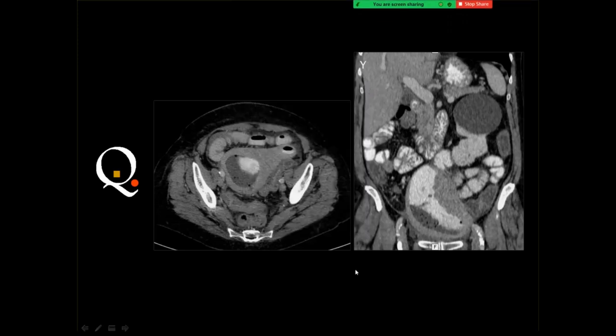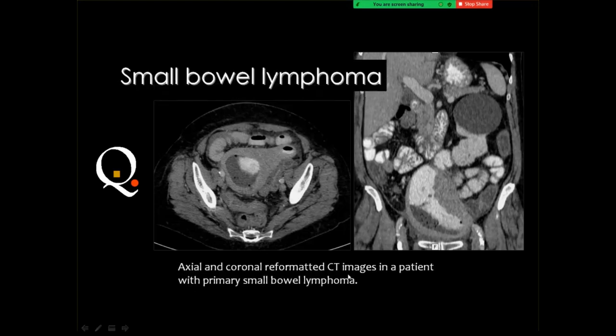And this is right because one of the major features of lymphoma is what's known as aneurysmal dilatation of the bowel loop. And this aneurysmally dilated bowel will show some of the orally administered contrast material together with some of the stagnant food in this dilated loop.